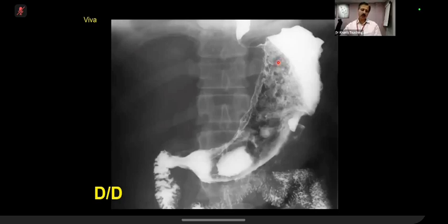So I'm presented with a spot fluoroscopic image from an upper GI barium study. There is gross abnormality of the stomach, specifically the body and pyloric antral regions, with multiple areas in which there are pooling of barium with surrounding less dense halo suggestive of cratering or mucosal edema. I can see 3 such areas along the greater curvature. Excellent, excellent. What do you think overall?